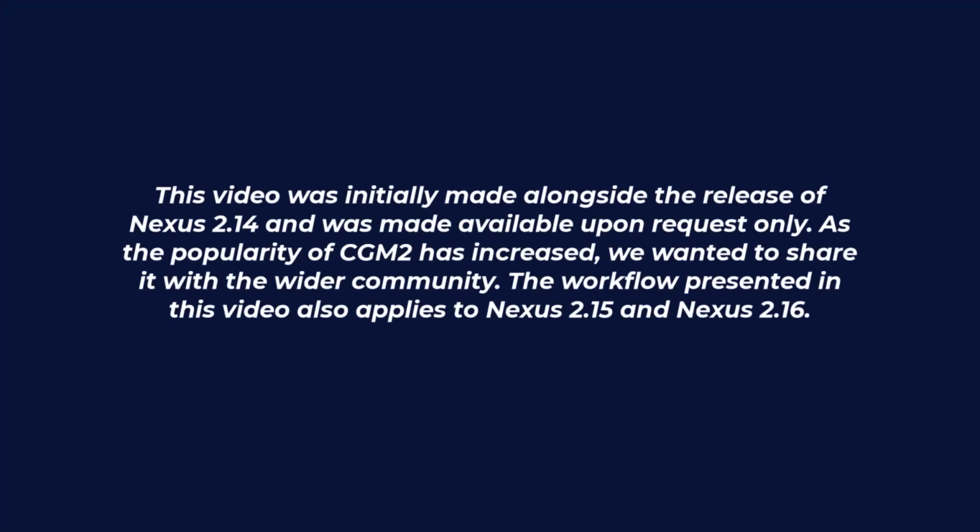This video was initially made alongside the release of Nexus 2.14 and was made available upon request only. As the popularity of CGM2 has increased, we wanted to share it with the wider community. The workflow presented in this video also applies to Nexus 2.15 and Nexus 2.16.